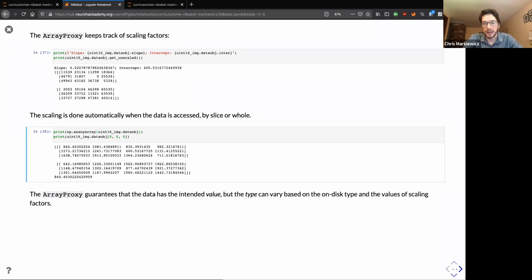So getFdata is designed to be a fail-safe approach, and anything else, when you start playing with the data object, this is sort of expert mode. Please know what you're doing.